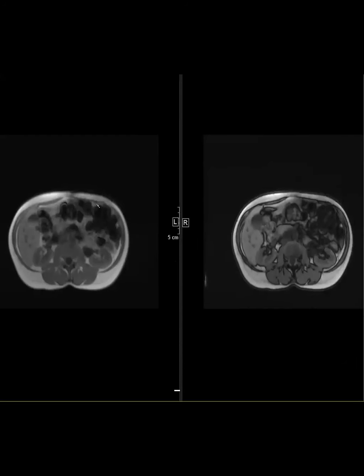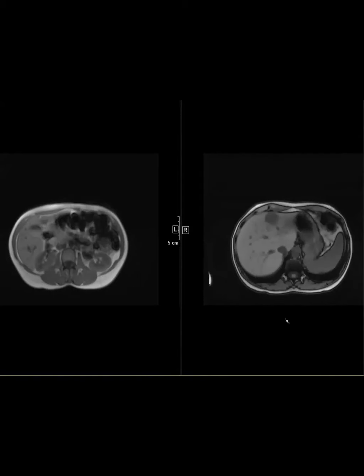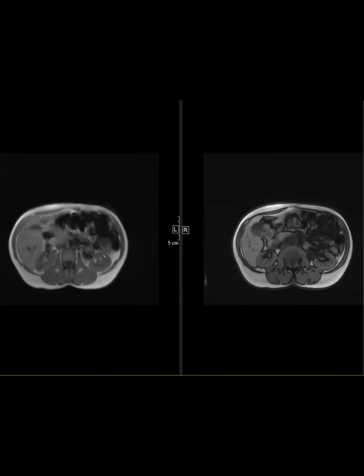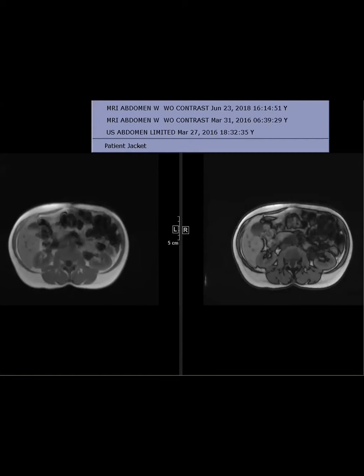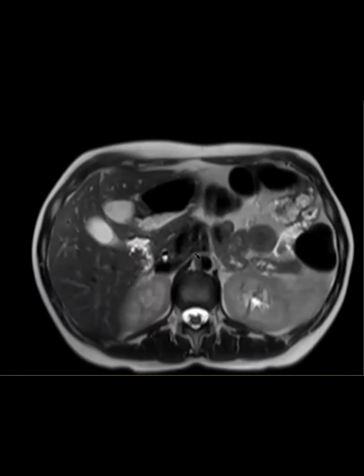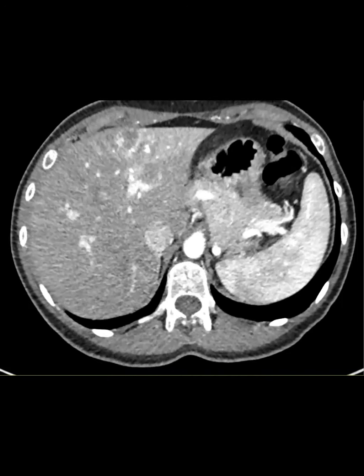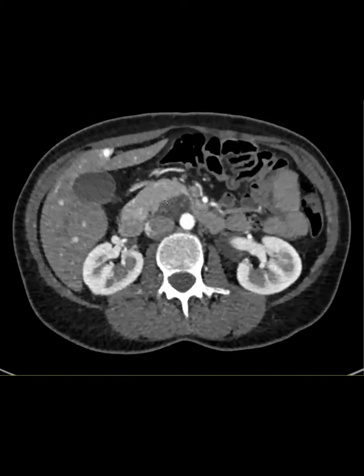So anyway, I thought it was probably some kind of lymphatic thing. And a couple of weeks ago, I showed that case of a lymphoepithelial cyst arising from the pancreas that had fat in it and was resected. My pathologist was saying they often have debris, like keratinizing debris. So anyway, we think that this was probably a lymphangioma or a lymphoepithelial cyst, with both that intravoxel fat, this T2 hypointensity, and this CT appearance where it looks kind of lobulated and hypodense.